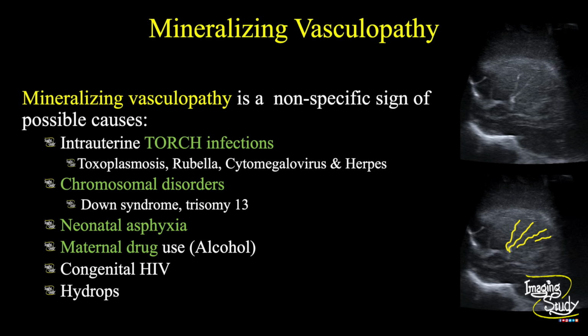It is actually a non-specific sign of some possible causes like neonatal asphyxia and intrauterine TORCH infections. Even it may be associated with chromosomal disorders and maternal drug abuse.